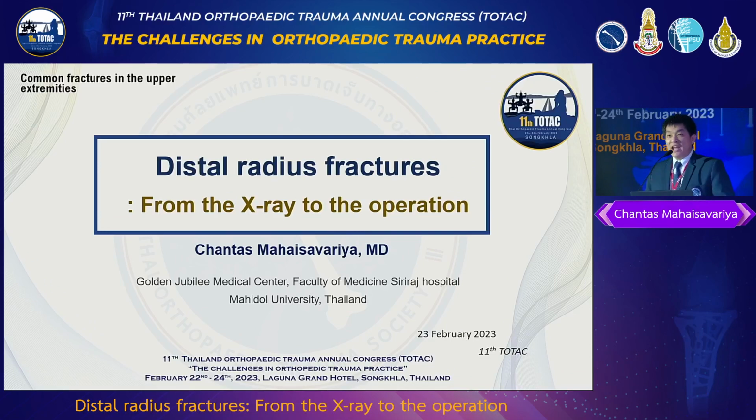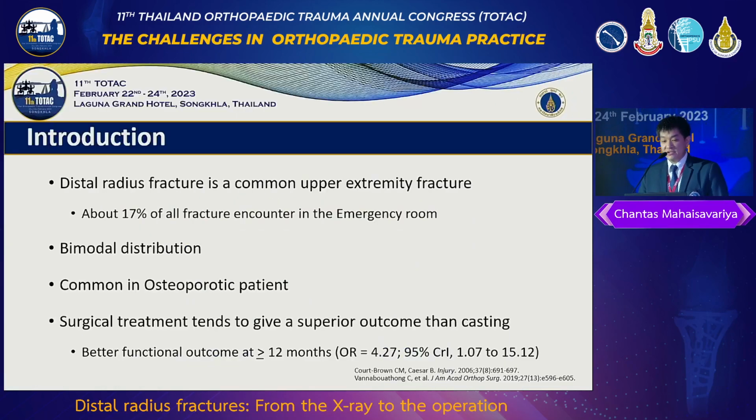Today I would like to share my experience of the cases. So this means it's sharing the cases, not a lecture. I would like to close the light to facilitate you to see the clear view of the distal radius X-ray, from the X-ray to the operations.